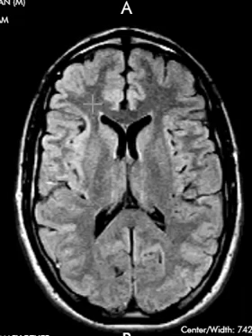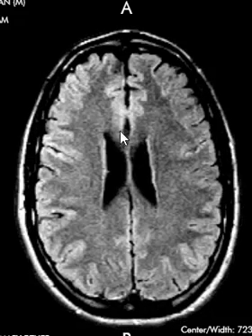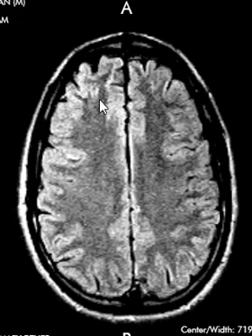And we look very carefully if patients have migraine headaches, if they have small vessel problems called chronic small vessel ischemia, they have abnormalities there. They can have strokes or bleeds in the brain, and we'll see geographic regions of abnormal brightness or darkness within the brain. And we also can sometimes see the brain pushed to the right or left. And so this is called a FLAIR sequence. Again, it's very, very sensitive for any abnormalities, especially in the white matter. So we look really carefully.